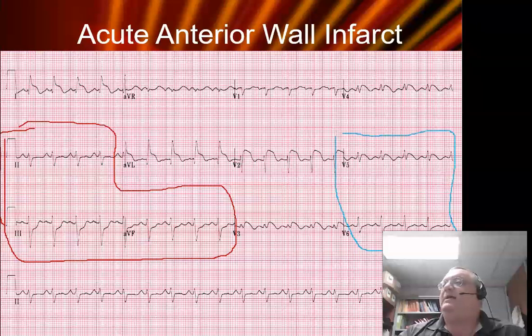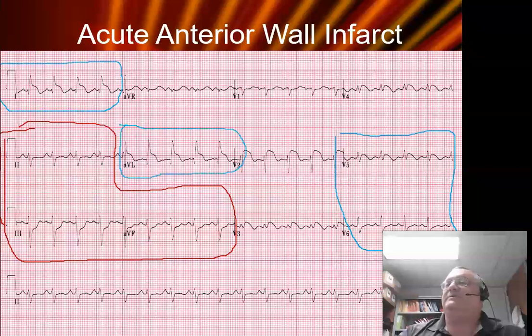As you start to learn this, please feel free to do the same. Notice how I'm using the colored ink on purpose, because I want you to make sure that you see what leads go with what.